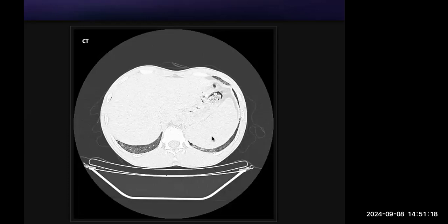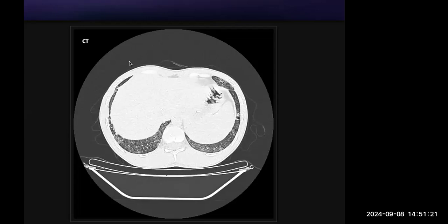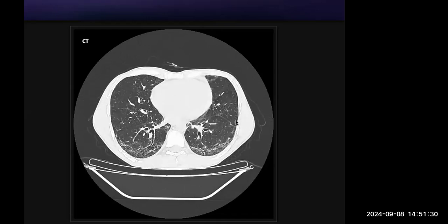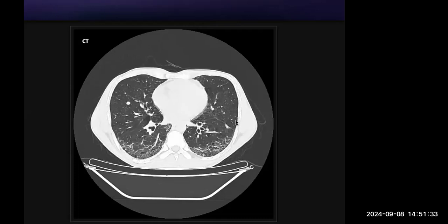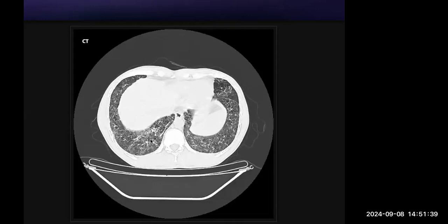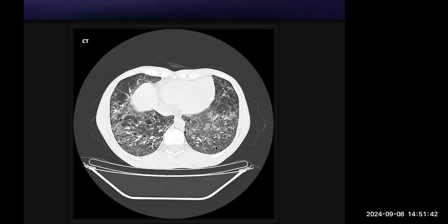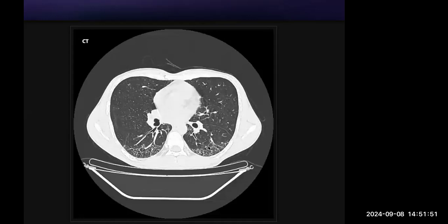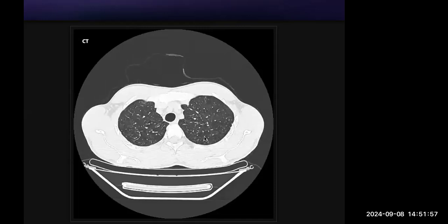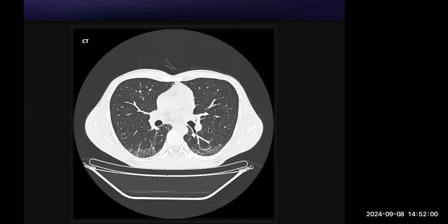Okay, I'm going through the HRCT chest of a patient in lung window, axial images. I'm able to appreciate diffuse reticulation in the bilateral lower lobes, predominantly the lower lobes. I'm not able to appreciate much in the upper zones or the upper lobes or the right middle lobe.